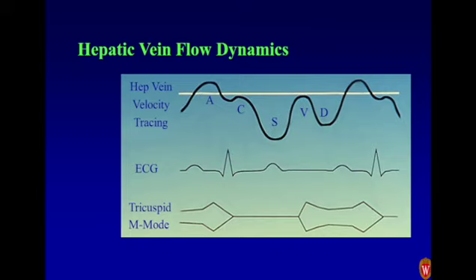Okay, same thing will happen above the heart. It'll go backwards up into the great vessels of the neck and arms. Okay, so now the atrium is finishing its contraction, and the velocity starts to flow forward again.